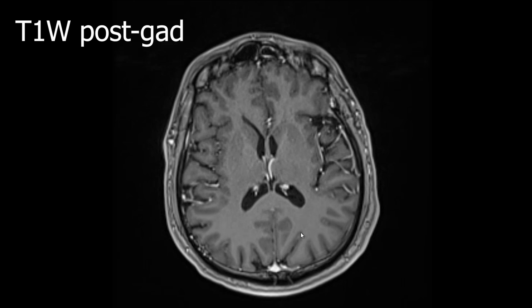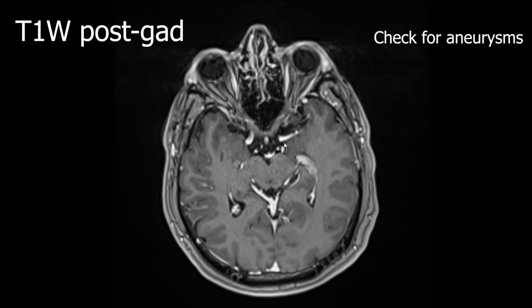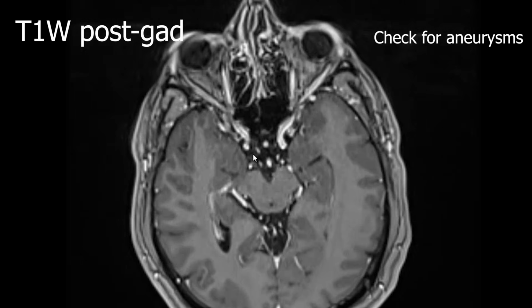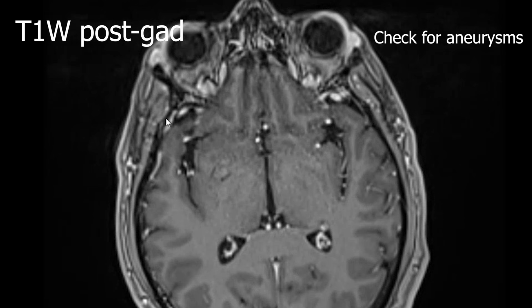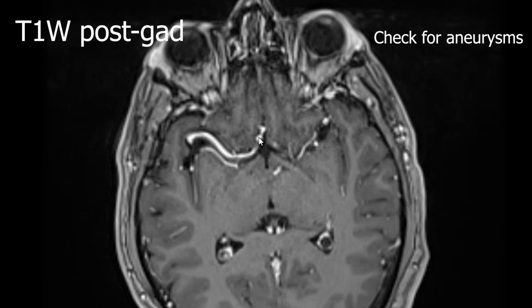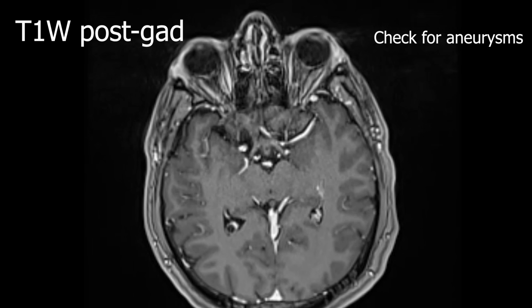If T1 MP-RAGE is part of the protocol, I actually prefer to check for aneurysms here. Again, I check here. This is the carotid terminus. I look at here. This is our basilar tip. These are here for MCA bifurcations and for ACOM. Again, I'm not talking about a very teeny tiny aneurysm. I just want to make sure I'm not missing a large aneurysm.